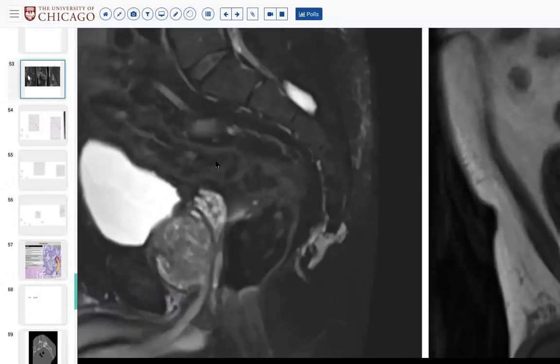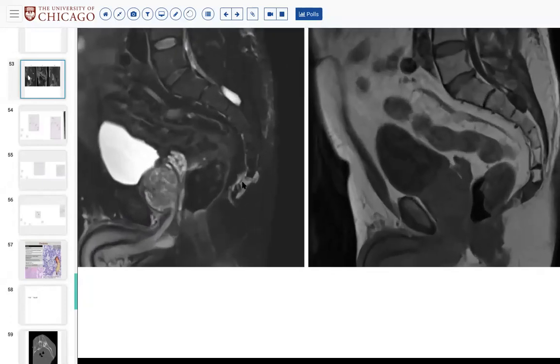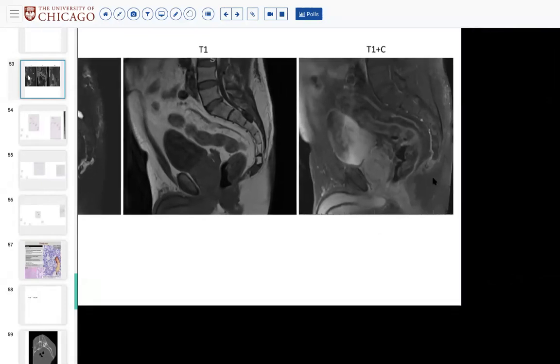So just remember, this is bladder, right? So this giant white thing is urine, and then the lesion is here. So we have a lesion at the tippy tip of the coccyx. So even before I show you the slide, what should your big, deep gyri and sulci already be thinking? You should already be thinking about a chordoma: midline, old dude, probably a chordoma.